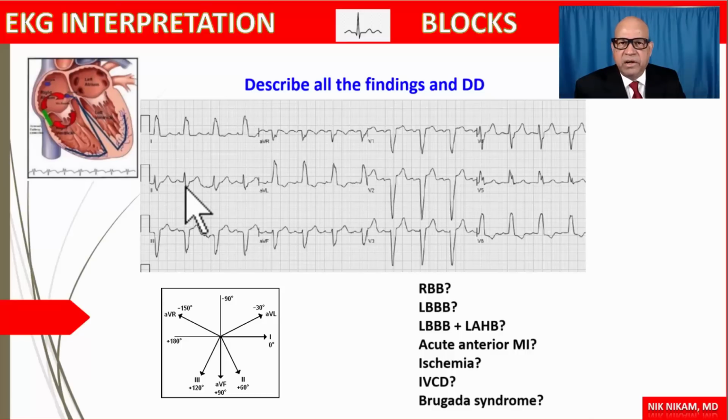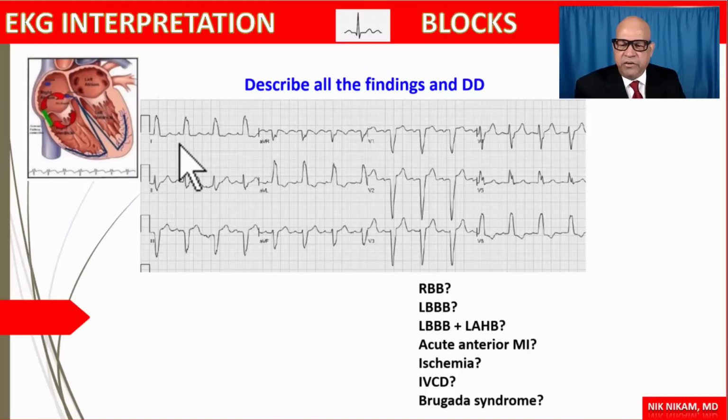However, if this is more than minus 45 degrees, then we would be talking about left anterior hemiblock and left axis deviation. However, this is not quite left anterior fascicular block. So in conclusion, we have sinus rhythm with the left axis deviation, not necessarily left anterior hemiblock. We have left atrial enlargement. We have left bundle branch block with discordant ST-T changes, and the ST elevations, which are a normal variant in patients with the left bundle branch block, do not signify myocardial ischemia or infarction.